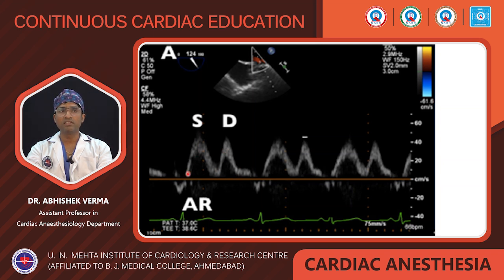When the LA contracts, it will cause blood to flow from the LA to the LV. But if the LV is poor, or diastolic dysfunction is there, or the LV is very stiff, the blood in the LA does not go into the LV. It goes back into the pulmonary vein because it is valveless, and that is represented by the AR, with the velocity increased and the time duration of the AR also increased.